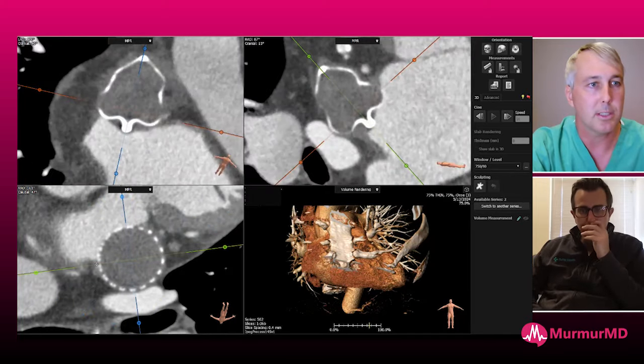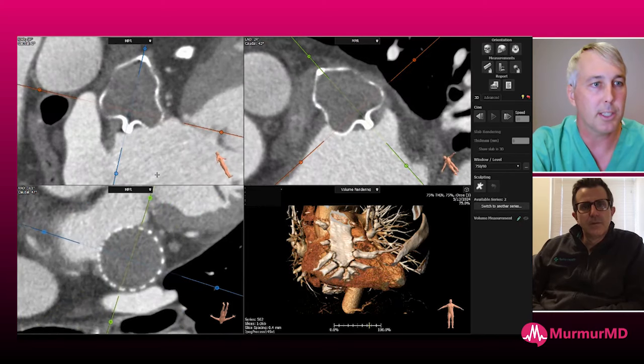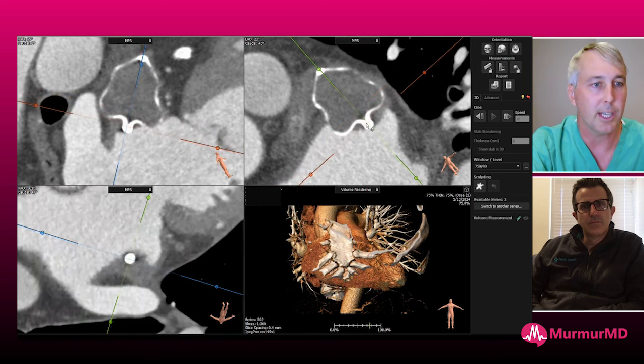So in doing this, we see 2 things. If you look in the top left, you see the limbus, and you see all this stuff kind of around the threaded insert on the device. So what is that?